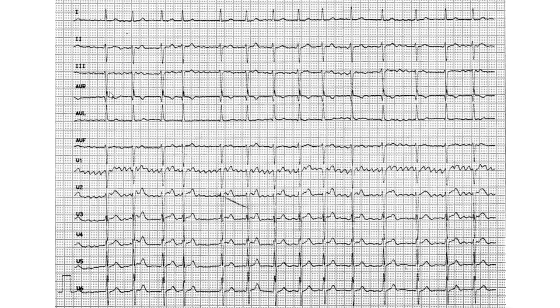Fourth point is the F waves. So we check them here. This is where they're most visible. Take two of their peaks. So here, these look like two nice peaks. Or here is very good. Yeah, here is good. So 1, 2, 3, 4, 4 or 5, I would say.